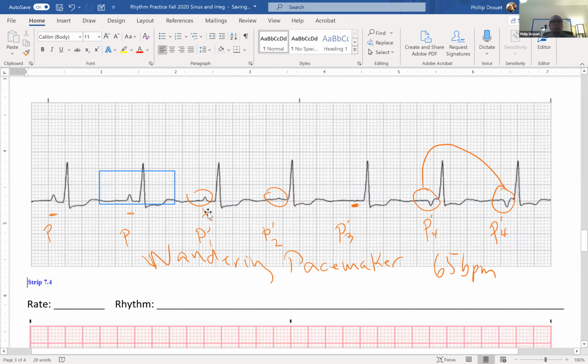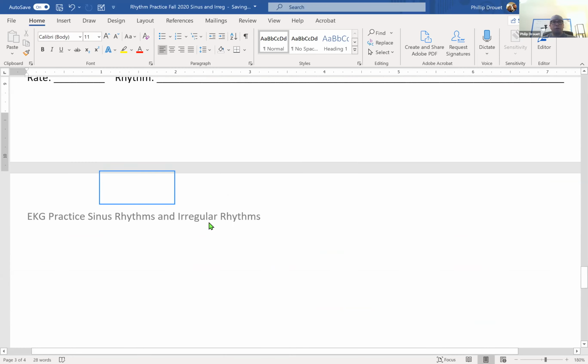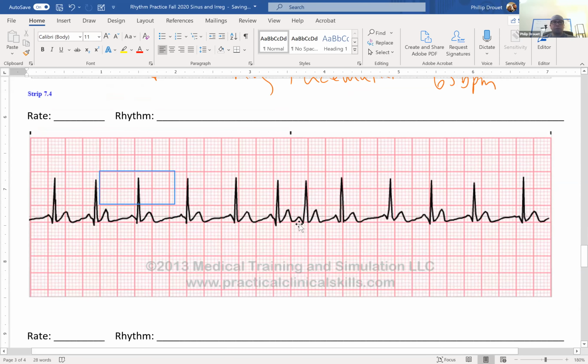Okay. All right. And with that, I'm going to leave you all with the last one to complete on your own. Thought I was going to help you with all of them. I am not. I will leave you with the toughest one on here. Okay. And for my students, if you have questions, be sure to email me.